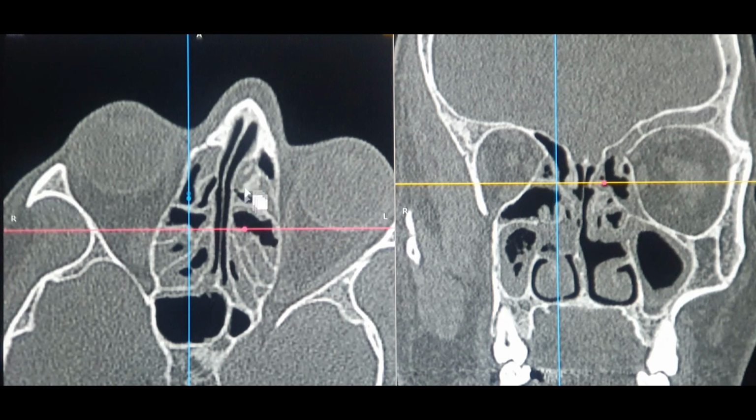Anything above this right now is all anterior ethmoids, because the basal lamella is the structure which differentiates the anterior from the posterior ethmoids. Whatever is anterior to this is always going to be the anterior ethmoids, and whatever is below this right now is going to be the posterior ethmoids, and this is the sphenoid, as you can see right here. This is a main distinguishing point which you have to understand, that this should be the basal lamella, which is really important.